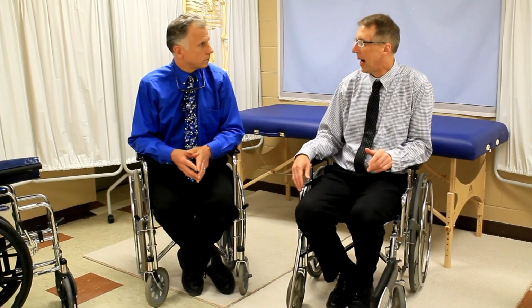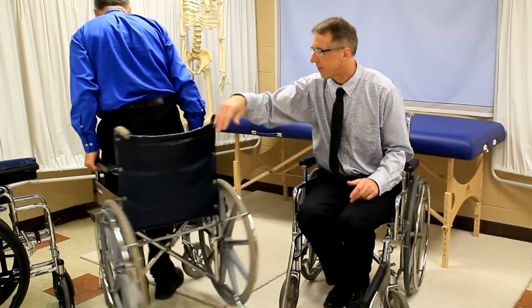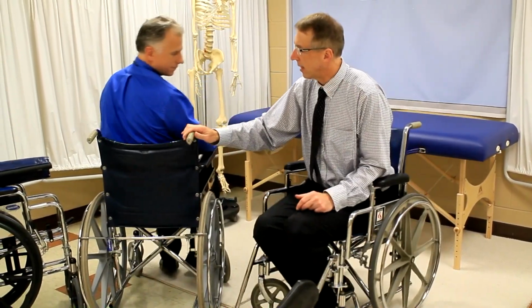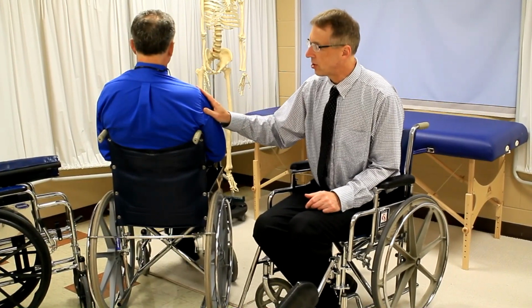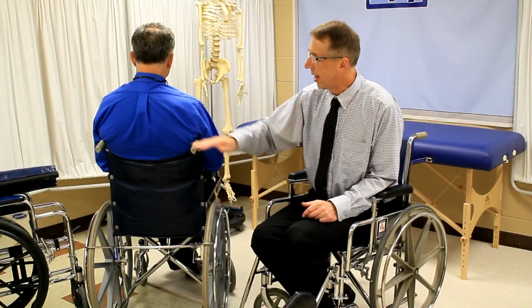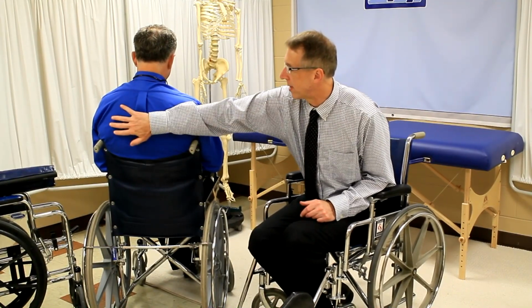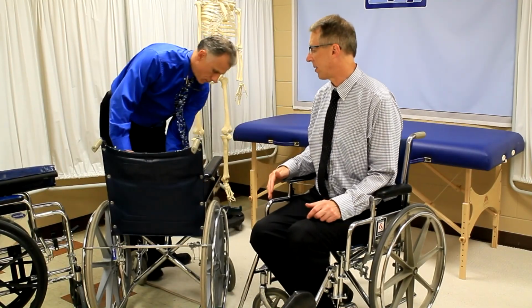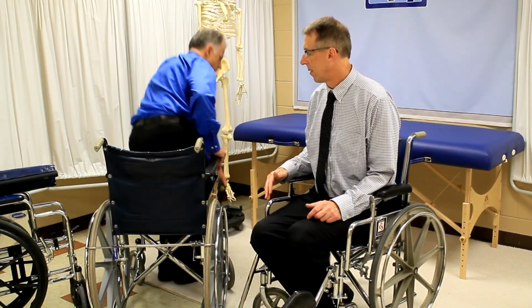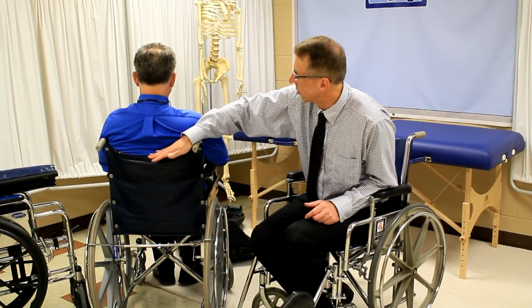All right, the next thing you're gonna look at is back height. All right, flip that around, Brad. Now it's going to depend on what you do. If you spend a lot of time sitting in a chair, I'd like to see a higher back height that actually goes over the shoulder blades and gives you lots of support. So if I take these out, you're getting closer, aren't you, Brad? Now you're getting some support on the shoulder blades.